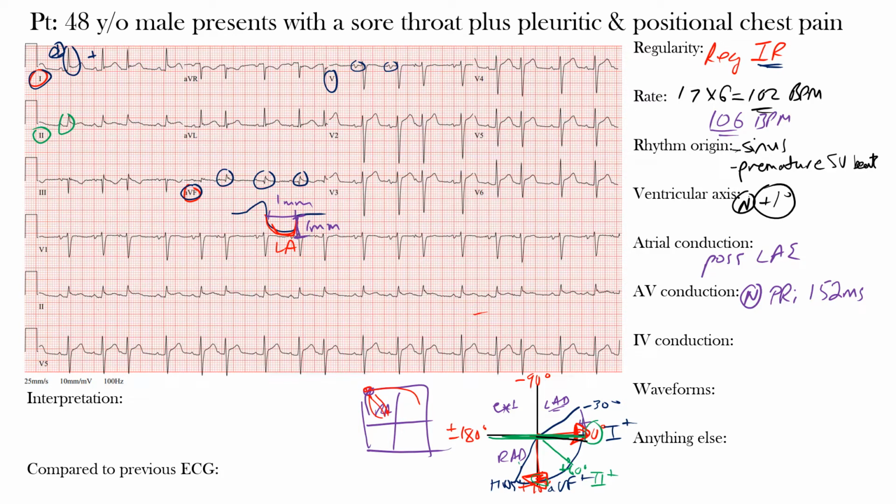On this ECG, we see narrow QRS complexes that appear within normal limits. In fact, the QRS duration here was averaged to be 100 milliseconds, so that helps to confirm that we are dealing with normal intraventricular conduction. So we can write in that the average QRS duration here was 100 milliseconds.